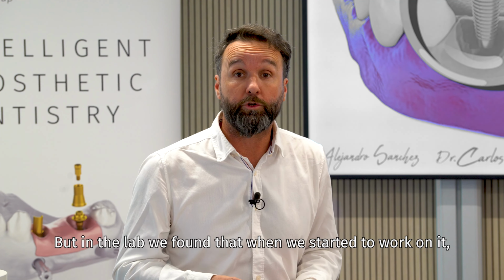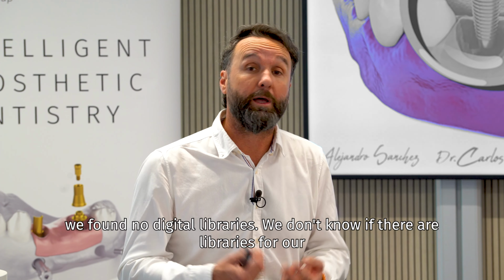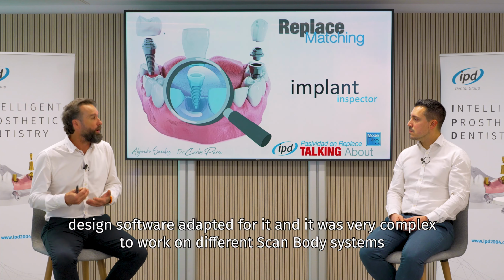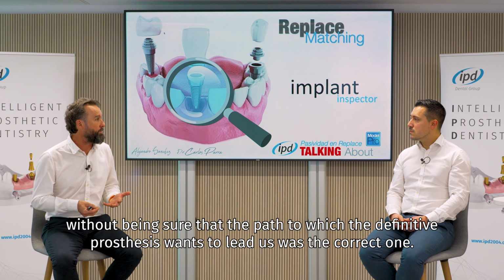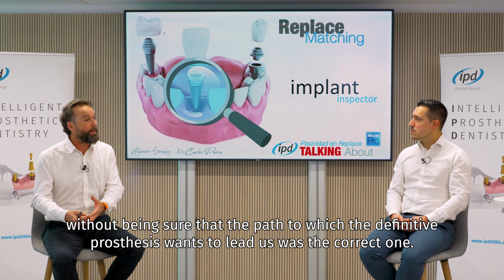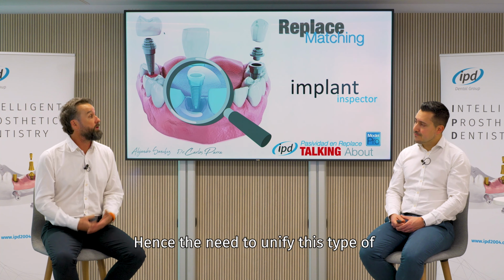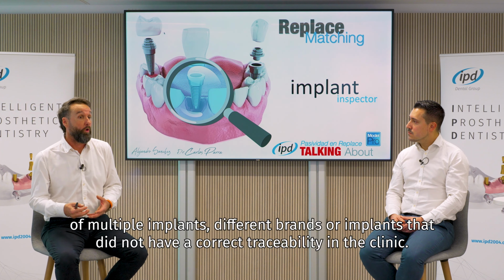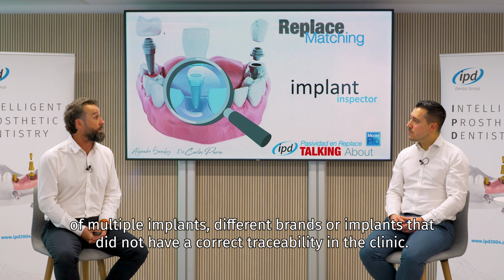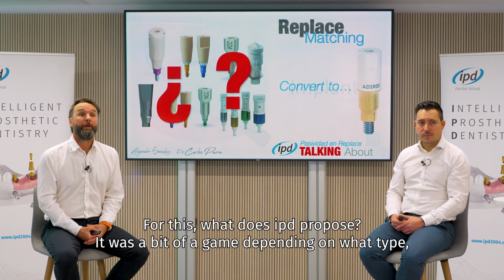But in the lab, when we started to work on it, we found no digital libraries. We don't know if there are libraries for our design software adapted for it, and it was very complex to work on different scan body systems, without being sure that the path to which the definitive prosthesis wants to lead us was the correct one. Hence the need to unify this type of multiple implants, different brands or implants that did not have correct traceability in the clinic. For this, what does IPD propose?